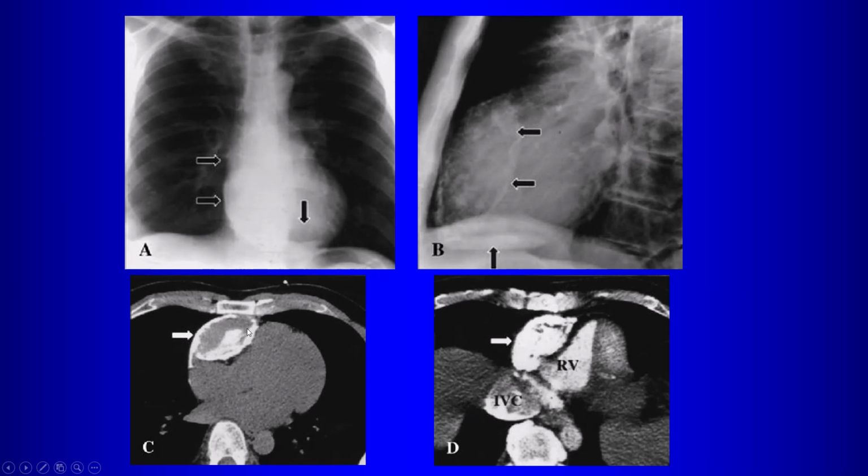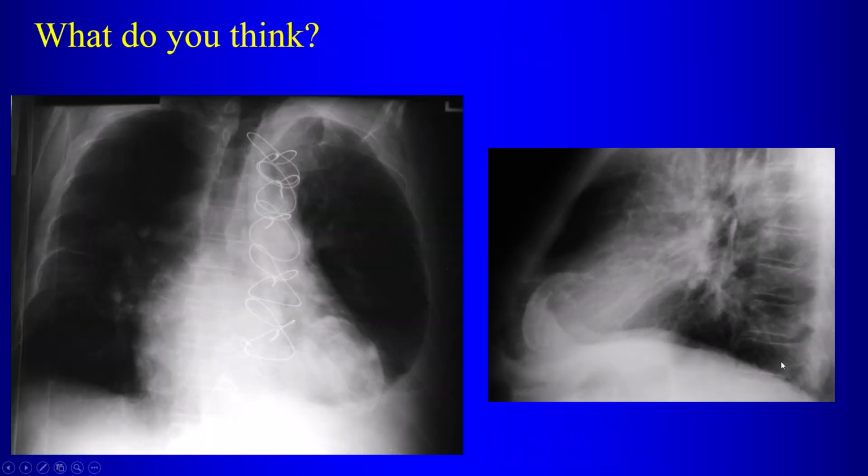Here's some unusual shape to these pericardial calcifications here, and we can see that there seems to be a collection here that is calcified, and this is also indenting the anterior border of the right ventricle. Notice also the IVC is dilated, indicating some element of filling disturbance here and constrictive pericarditis.